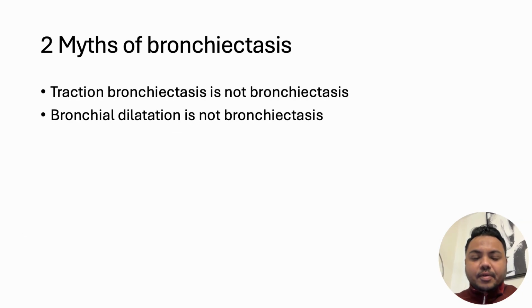So let's begin first with a couple of myths that exist with bronchiectasis. A. Traction bronchiectasis is not bronchiectasis. In today's day and age, we use the term secondary bronchial dilatation rather than traction bronchiectasis. And bronchial dilatation is not always bronchiectasis.